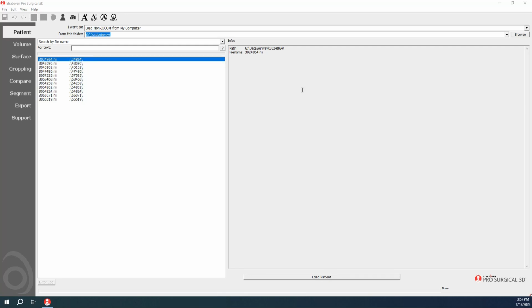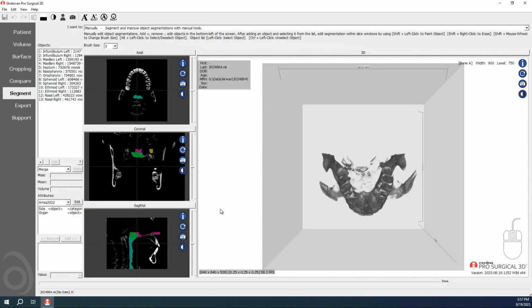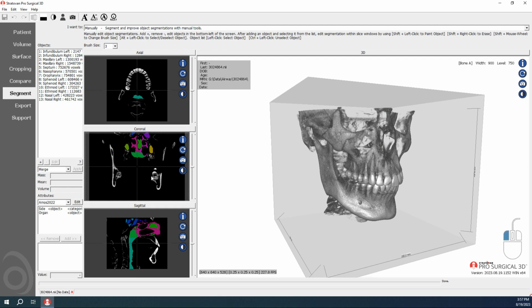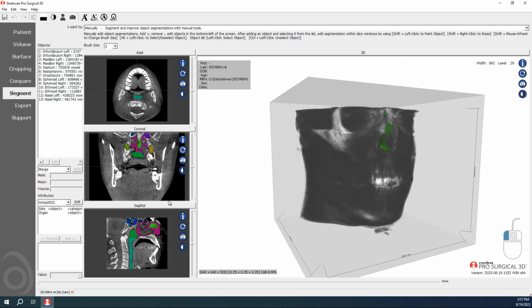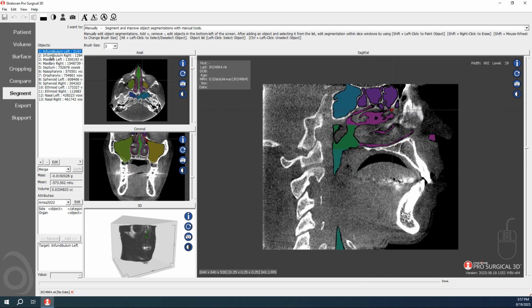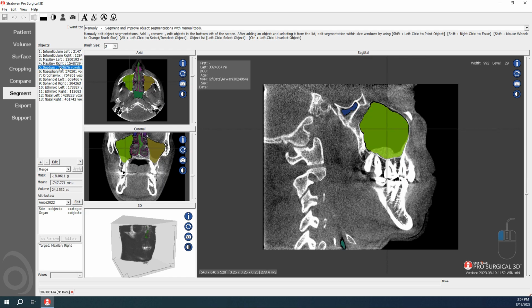In this video, we'll examine some airway segmentations, perform attribute relabeling, and discover some problems with labeling. This is the kind of data that we're working with here. We have a cone beam CT scan of patients, and we have airway segmentations here. You can see all the different parts of the airway identified through these object segmentations.